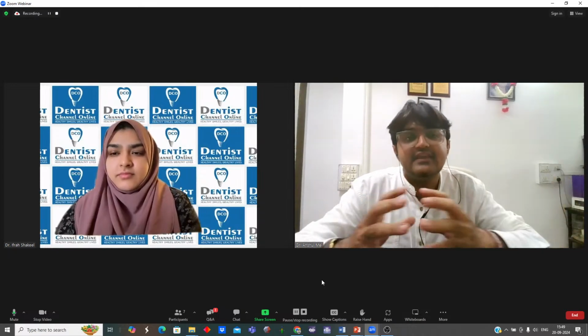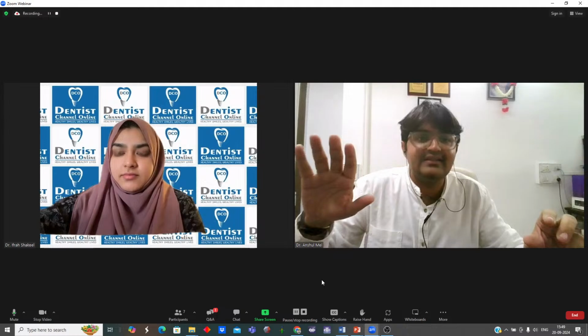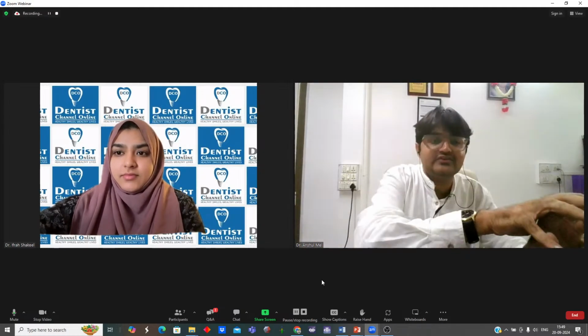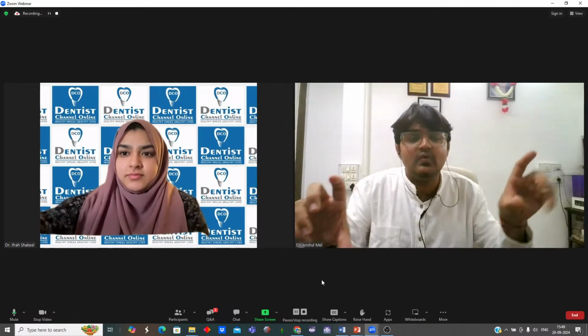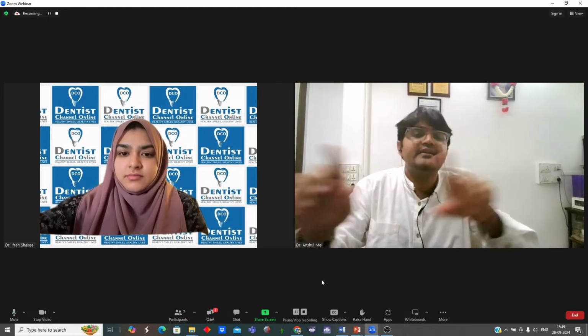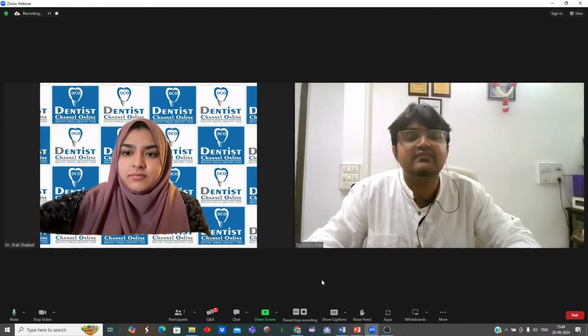So it's easy when you want to plan in Exoplan. You can design, for example, a smile design, anything you want to do, you can do it in ExoCAD. You can take the complete data into Exoplan and plan the implant accordingly. So it's connected with the lab. If you want to design the prosthetic after the implant plan, you can design it. That's why I recommend you go with Exoplan, so you have more connectivity with your lab also.